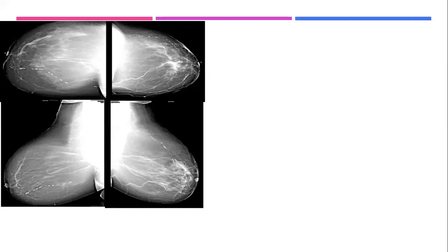Okay. This lady, an elderly lady, had open heart surgery, after which she developed an ulcer in her left breast.